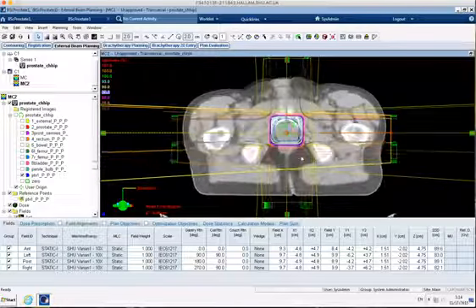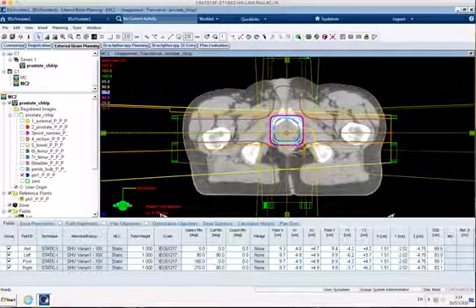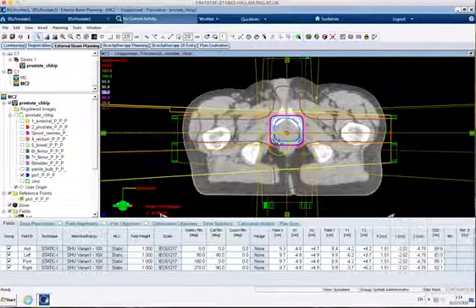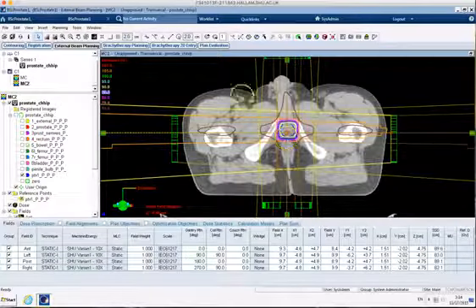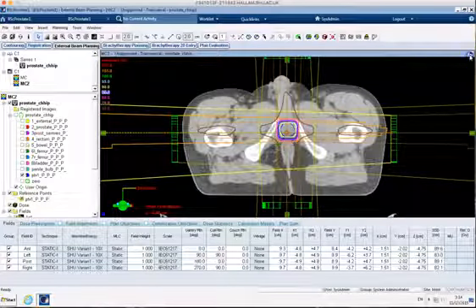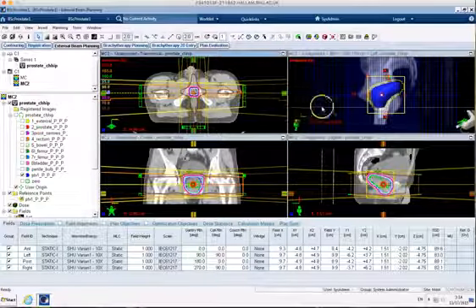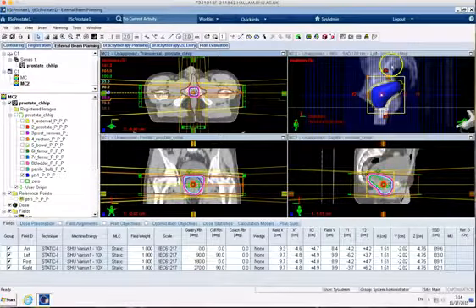So that 0.5 all the way around, on most slices we're not a million miles from where we want to be, but one place where we are underdosing a little bit is here, this point here. Now I'm fairly familiar with looking at 3D images, so I know that this is pretty much the bottom slice, but if you're unsure, what we can do to check is this grey line here shows exactly where we are in that view as well.